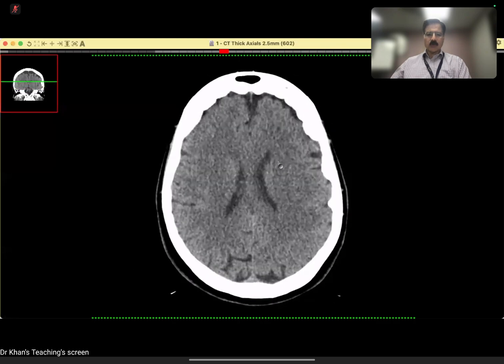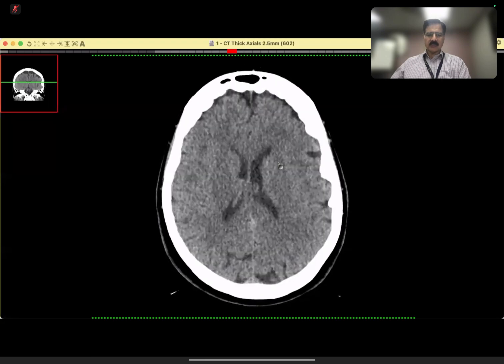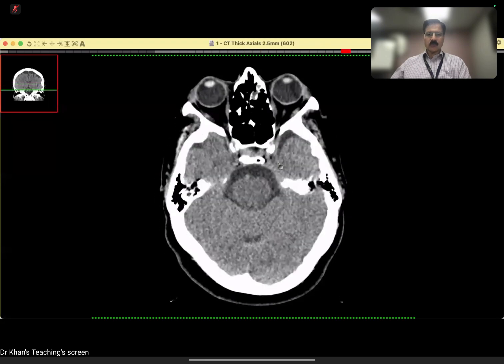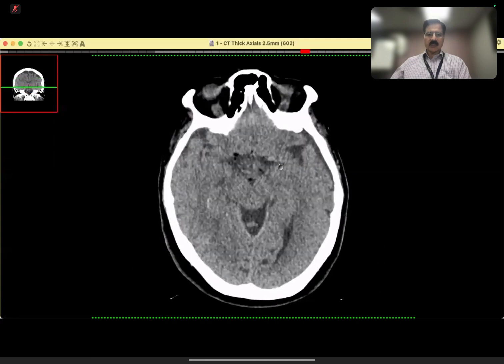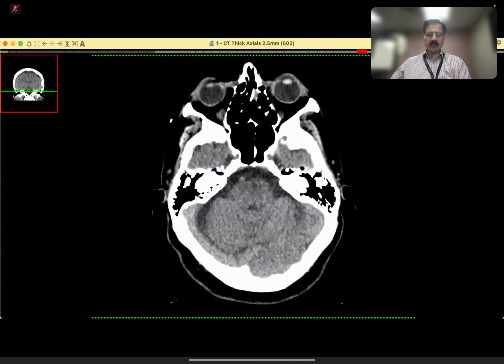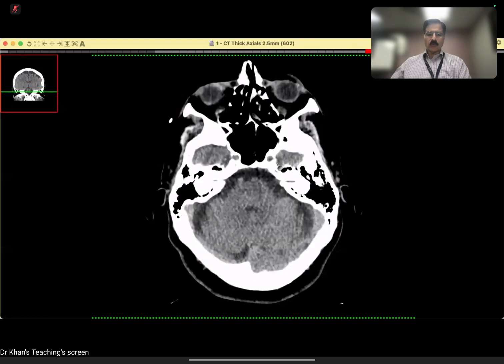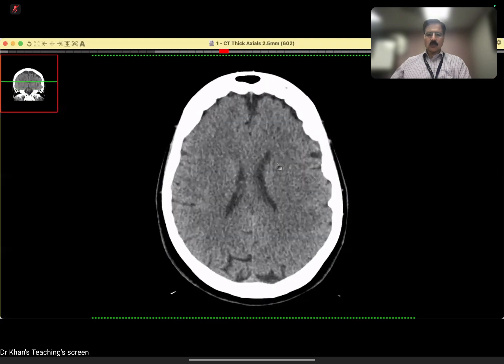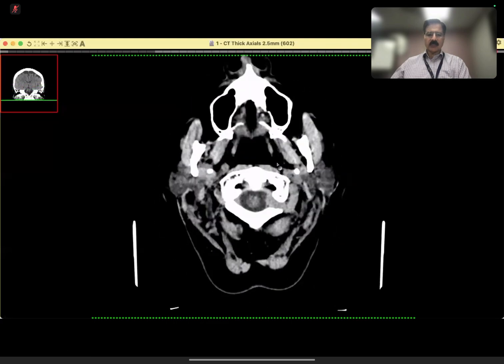And one of the key points here is that you picked up the finding very well, but you assume that this is pneumocephalus. So that was a catch in this case. And of course, this is what will happen in the exam also. The examiners don't have time, so they will guide you that on bone window there was nothing. So once you pick up the finding, now you start looking for the dermoid.